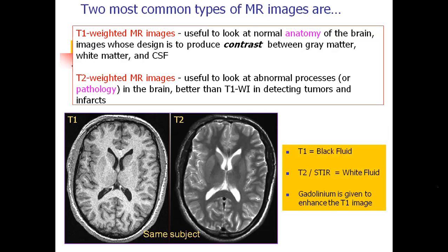In summary, T1 weighted images can be recognized by black fluid, T2 or STIR modality, by white fluid, and contrast enhancement with gadolinium is given to enhance the T1 weighted images.